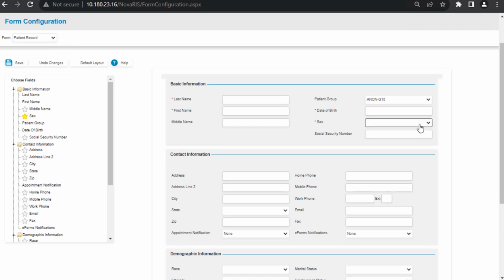So if you do not have it, if it's female, male, or other on there, they will not be willing to pay for that information. So for that reason, some insurance companies will require you always to have this field, the patient sex, required, you can just go and do it. And now you are going to be sure that whenever you are scheduling patients, they will have to type that information, and that will help you in the long run, also on the billing side of the system.